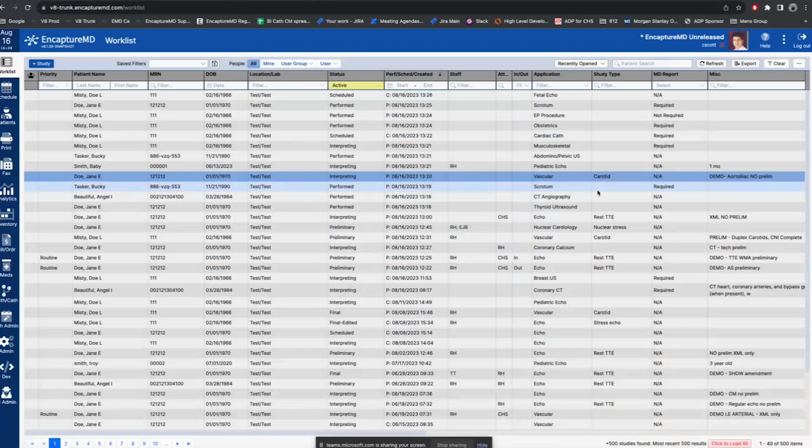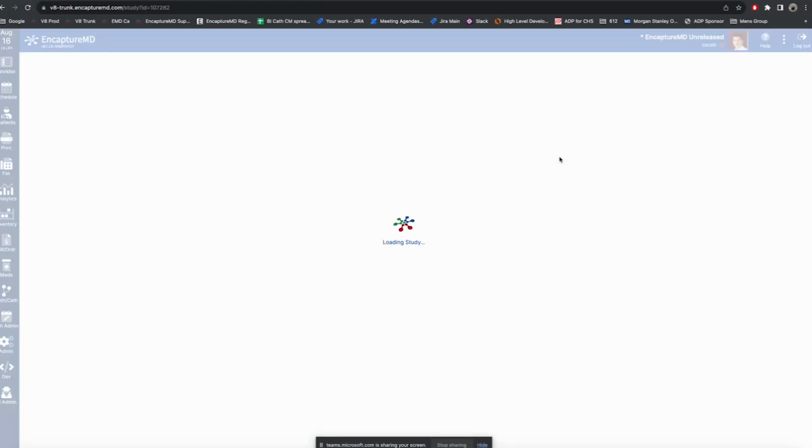Okay, so that is the vascular studies. And you can see on the right here, there's fetal echo. We've got some radiology things like scrotal, OB, musculoskeletal, abdominal pelvic. All of those are possible. It's NovaCardio, so the NovaCardio part is really focused on the cardiology components. Just know that we also, because of the similarities of ultrasound imaging, we also have the ability to do various radiology applications. And I'll just touch on one here to give you a sense of what we have. So let's just look at an abdominal pelvic ultrasound.